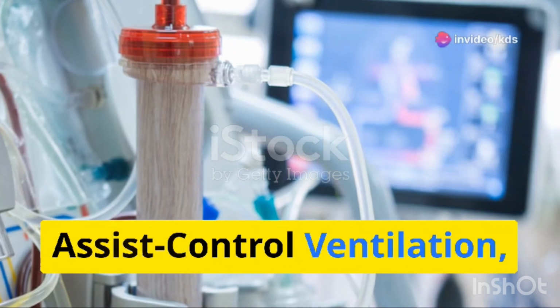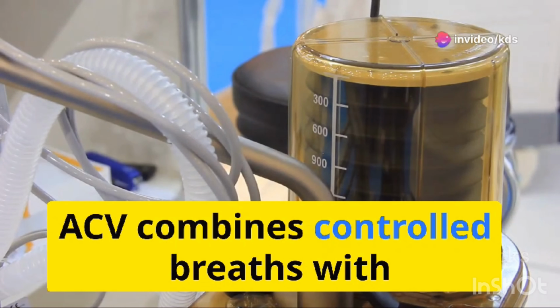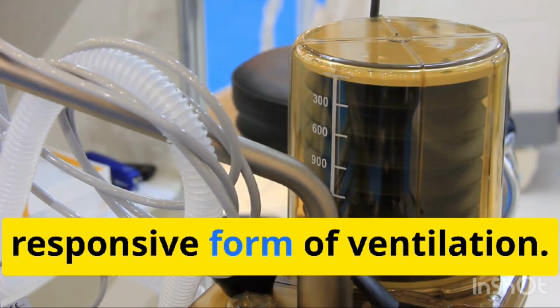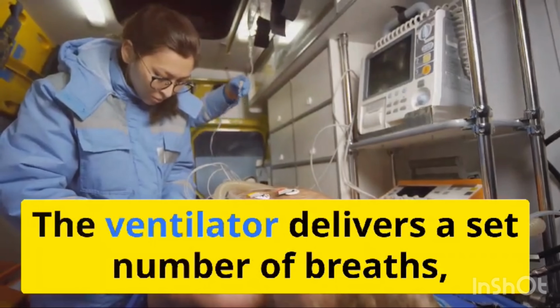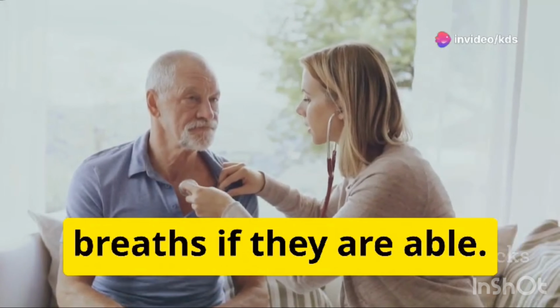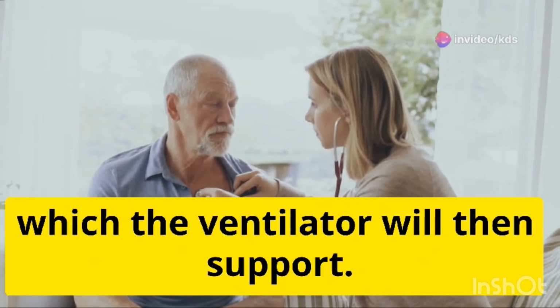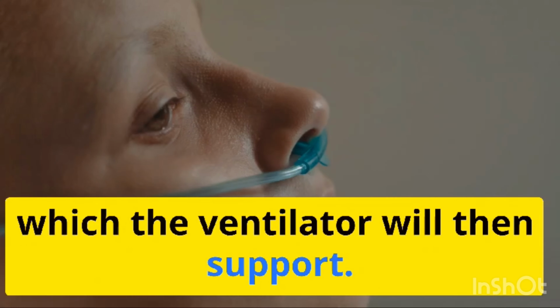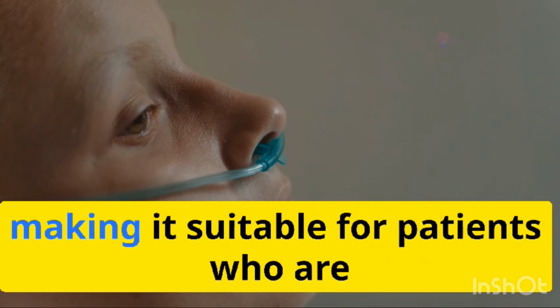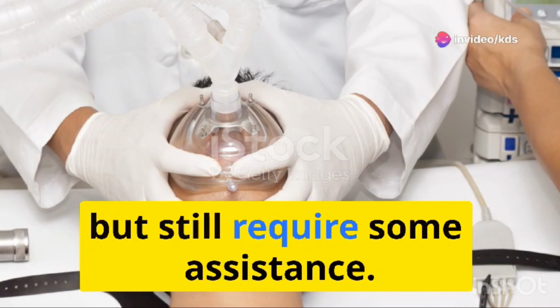Assist control ventilation, or ACV, offers a different approach. ACV combines controlled breaths with assisted breaths, allowing for a more flexible and responsive form of ventilation. The ventilator delivers a set number of breaths, but the patient can trigger additional breaths if they are able. This means that the patient can initiate breaths on their own, which the ventilator will then support. This mode allows for more patient comfort and participation in breathing, making it suitable for patients who are partially able to breathe independently but still require some assistance.